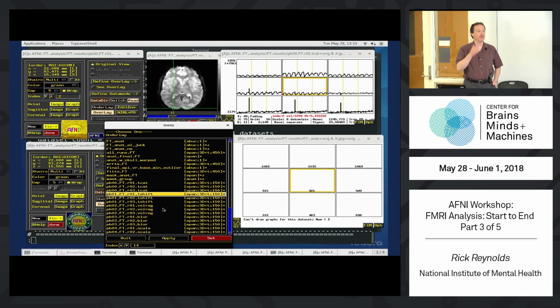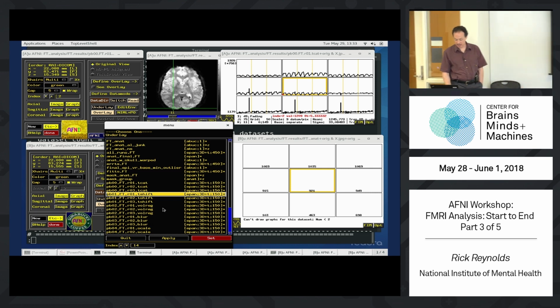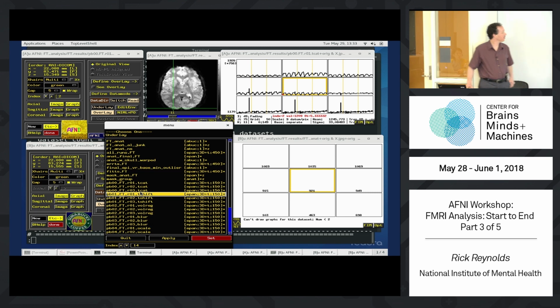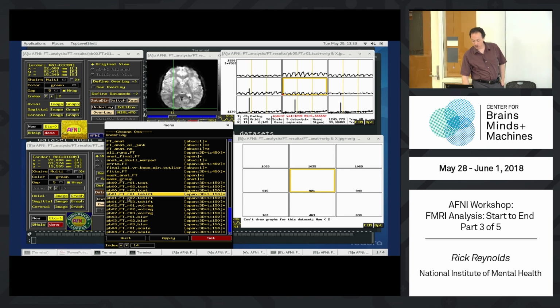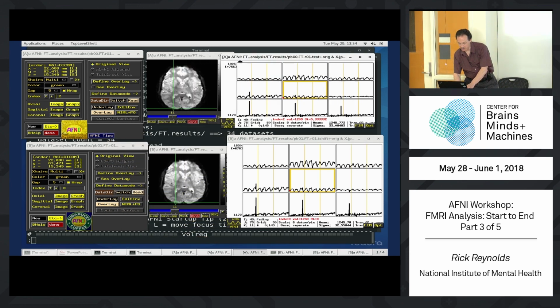When we finished off, we were just going to start comparing the original data, which is just missing the first 2 time points, with the time-shifted version. So presumably some of you have actually hit the set button or not. But just to be sure, on controller B on the bottom set of controllers, I'll choose run 1 of the PB01 T-shift data. Now just to compare these a little bit, I'll raise this one up a little.